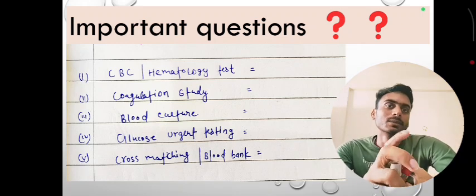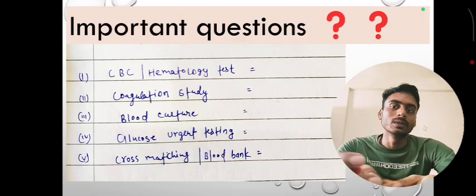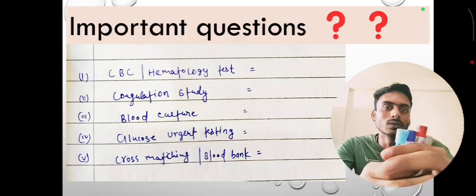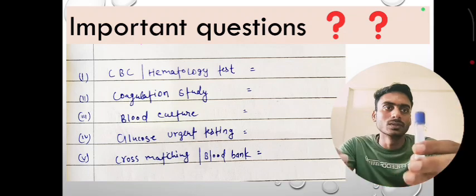If you want a CBC or a hematology test, then which kind of blood tube is used? For a CBC you just use the lavender color.